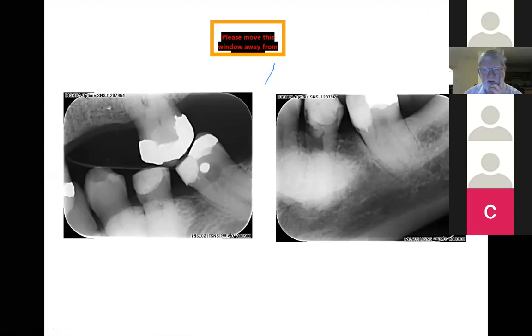Okay, mandibular torus, very good. Pulpstone 1-6, okay. Yeah, it was a torus. External cervical resorption, yeah, external root resorption, quite aggressive of that tooth. It had to be removed. Patient is in his 80s.